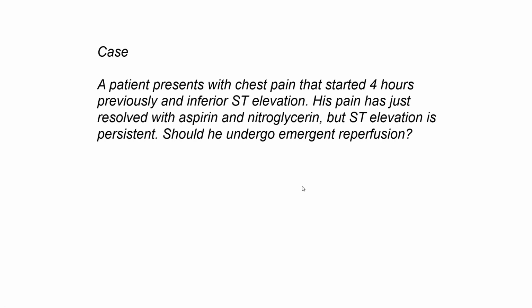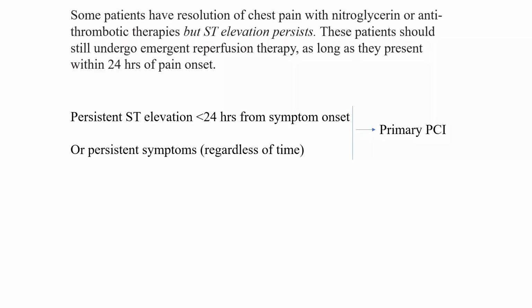And here's the reason why. I mentioned in the prior talk, transient STEMI. If chest pain resolves and ST elevation resolves, then you can wait till next day. This is what we call transient STEMI, a subgroup of which is self-aborted STEMI. But this is not the case. You still have ST elevation. Therefore, you still have ongoing ischemia and severe ischemia and injury.